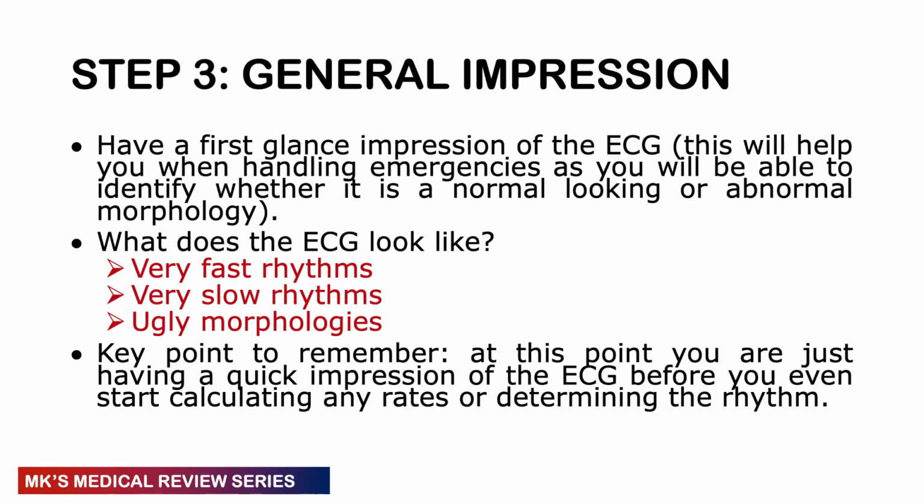Take note here, you're not giving any diagnosis, you're just having a quick glance at the ECG so that you can understand what is going on. Ask yourself 3 important questions. What am I seeing? Is it a fast rhythm? Is it a slow rhythm? Are there ugly morphologies? It doesn't look normal. It looks like a weird pattern.